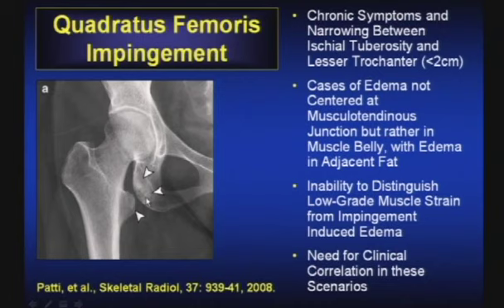So what might be the secondary findings? Sclerosis, cyst formation, hypertrophic bone formation, if we're looking on plain film. Okay, here certainly that space does seem narrow. It does seem like we're seeing sclerosis remodeling at both the lesser trochanter as well as the ischial tuberosity.